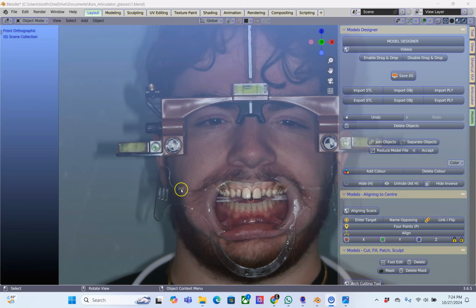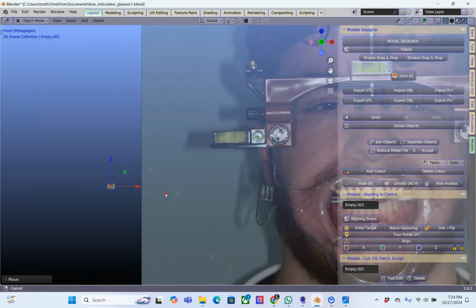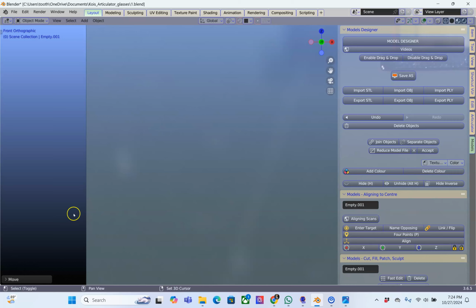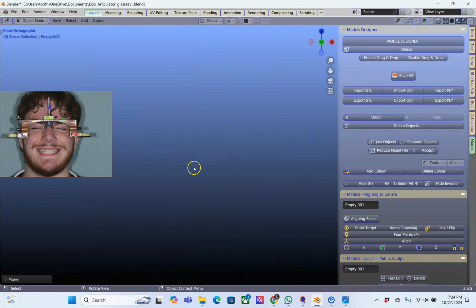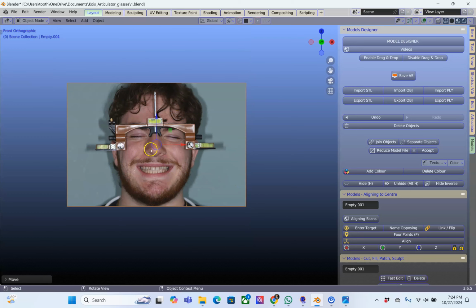Alright, in the second part of the video, I've got another photo here. It's very small, you're going to have to look for it. Sometimes these photos are different in size depending on how they are put in. Now, this photo, actually, I've dropped it in here. It is not the same.